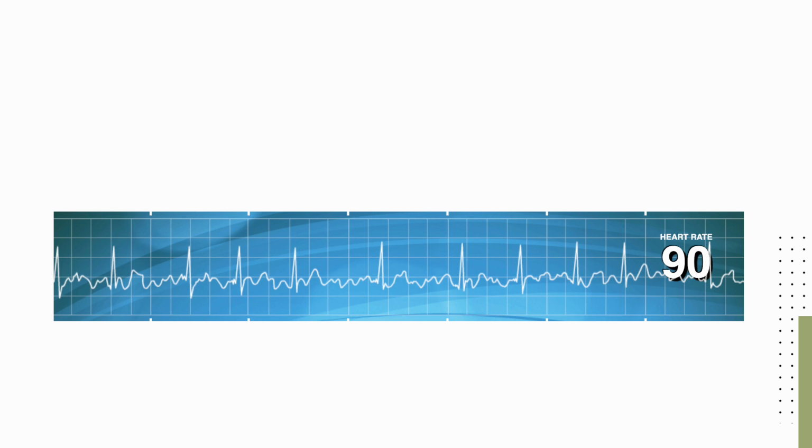The next arrhythmia is one of the most common. This rhythm is defined by its irregularly irregular nature with no discernible P waves. A good rule of thumb is that if you are squinting at an EKG trying to find P waves and you have an irregular rhythm, it's probably AFib. AFib, or atrial fibrillation, originates from irritable foci around the pulmonary ostia in the left atrium. Now that's a board's question.